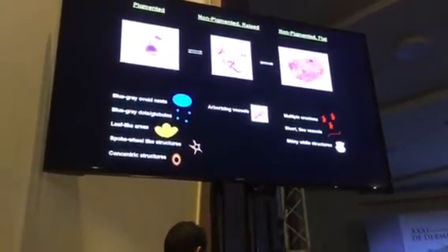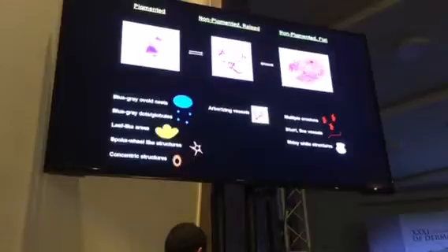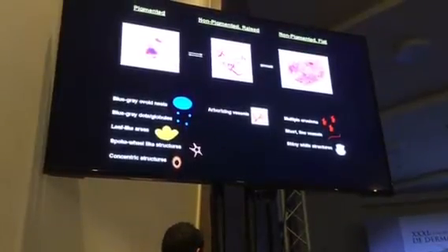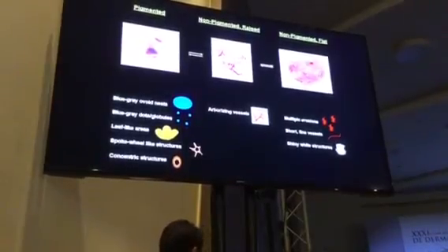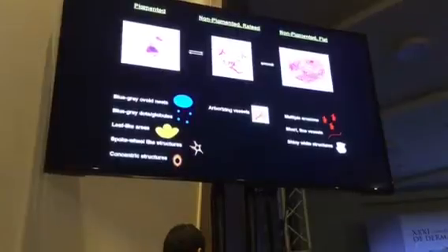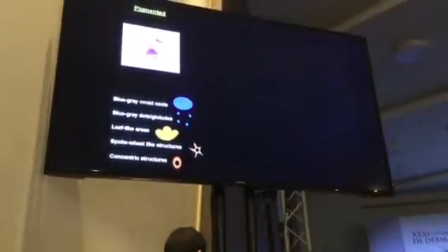In those cases, the pigmentation is what allows you to arrive at the diagnosis much more than any of the other features. For non-pigmented lesions, there are both raised and flat lesions. For raised lesions, arborizing vessels is almost always the most important feature. And for flat lesions, these are more challenging. But on dermoscopy, the most important features are erosions, vessels, and shiny white structures. So we'll go through each of these in a little bit more detail.